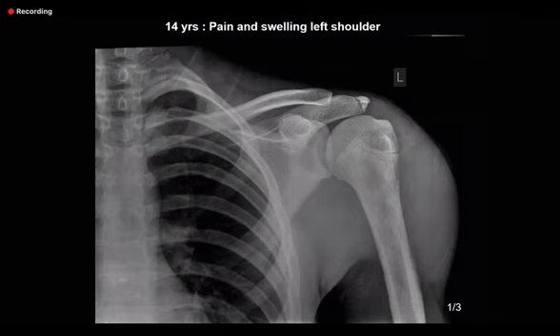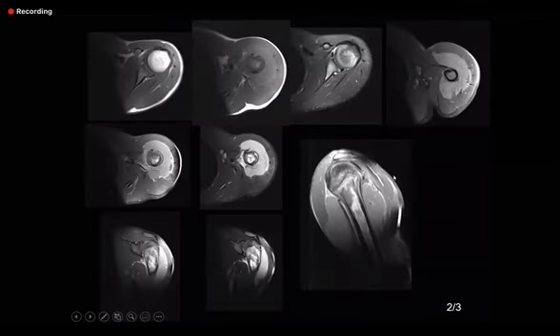And on the other hand, this is Ewing's. And so here you did well. There is permeative bony destruction, a wide zone of transition, soft tissue component. Here the key finding is that look at this soft tissue. The whole of this is enhancing, and you did very well where you picked that up. And there is disproportionate thickness of it. There is no abscess formation, intraosseous abscess or periosteal abscess, soft tissue abscess.